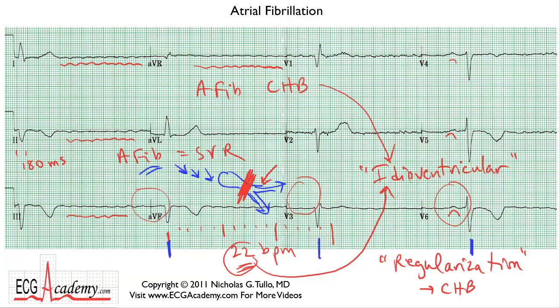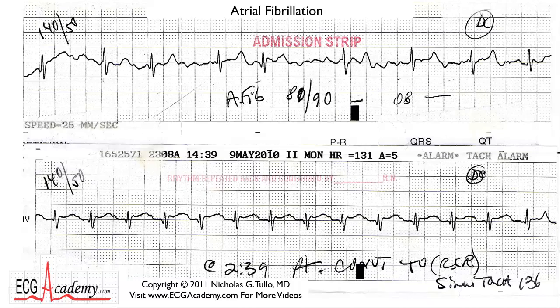Anyway, let's look at one more ECG. And this is actually a rhythm strip that I got from the telemetry unit. If you look at the forest, you can see the QRS complexes do appear to be irregular. This is a bit shorter, and then it's longer, and then shorter, and then longer, and then a couple of intermediates, so there's no pattern to it.